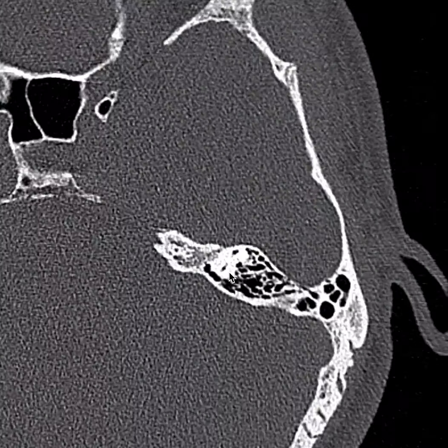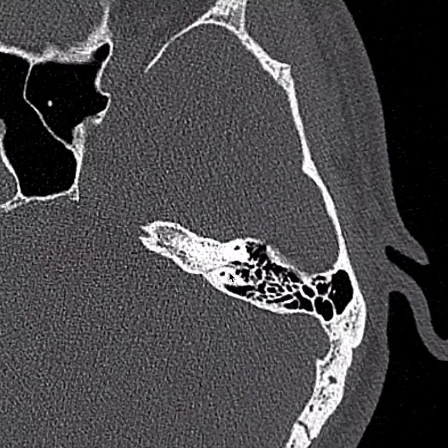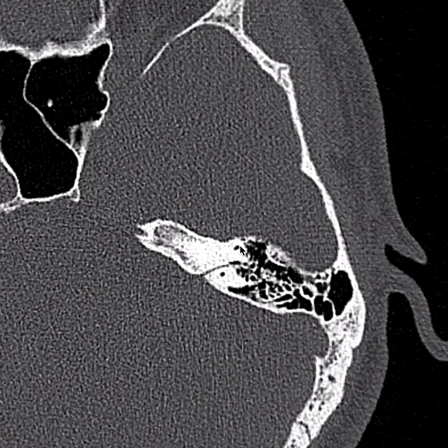Coming back down now, we're going to watch the subarcuate foramen go right between these two limbs, the anterior limb and posterior limb of our superior semicircular canal. This is the subarcuate foramen, and it carries the subarcuate vessels. The most important thing to recognize is that this is a normal structure and does not represent a fracture.